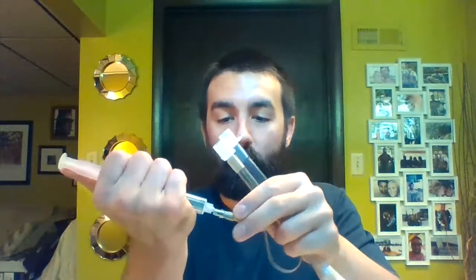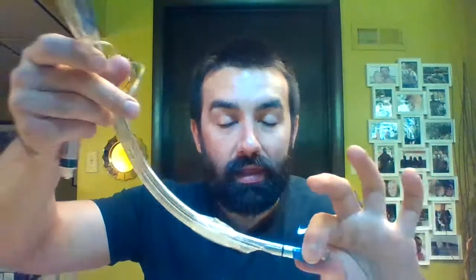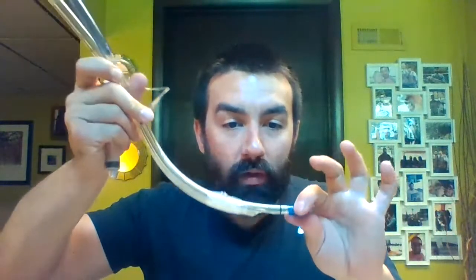I only got 1 pilot balloon here, but usually these would have 2. One of mine got ripped off. I got a leak because of it here. This one's kind of torn as well. But you can see this tube would go ahead. You have an opening here and then an opening here. And we can actually get that thing endobronchial.